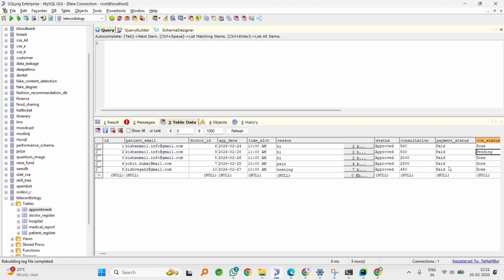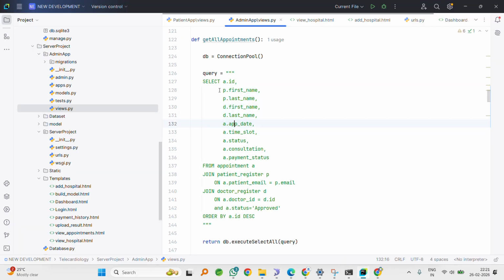Now these are all going to be in the pending state until the admin generates the payment. If the admin generates the payment, it is going to update here, and the status is generated. Okay, now the status becomes generated. Now the consultation is done. Okay, for four requests consultation is done. The total request status is updating like this. If the consultation is not done, it's showing pending.